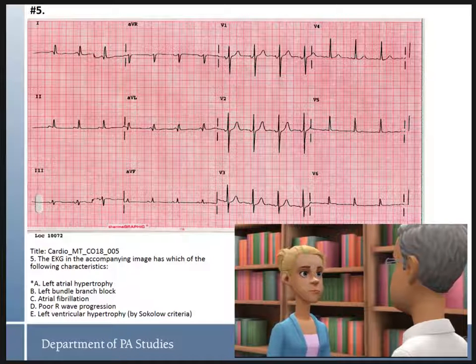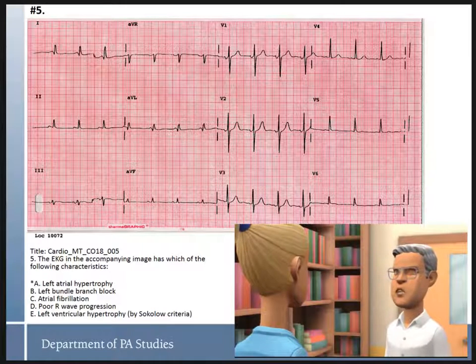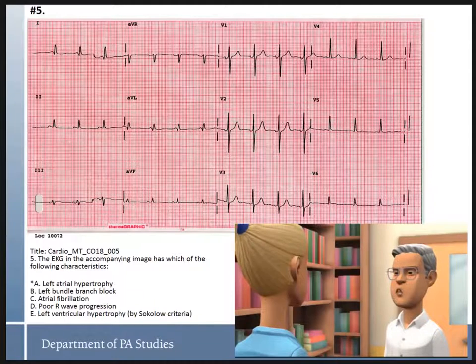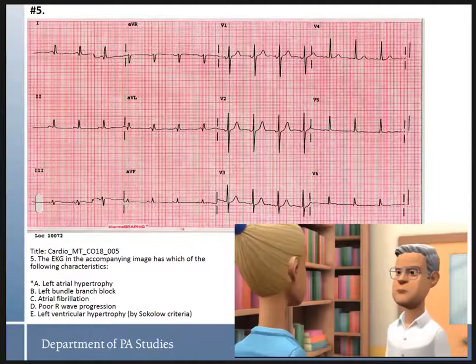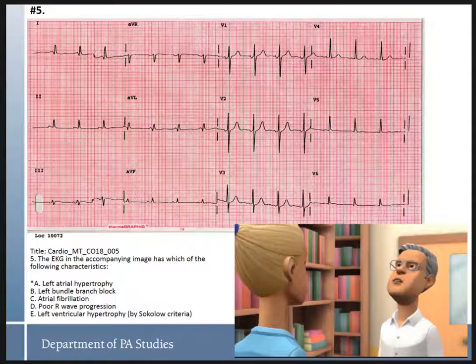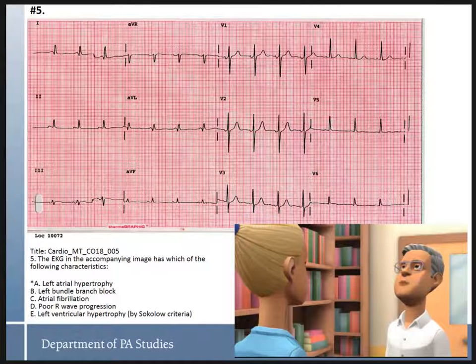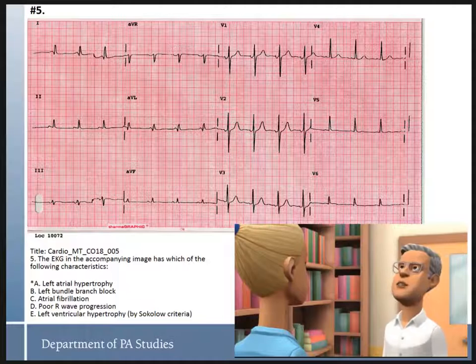I called it a left bundle branch block. If that is truly the case, then I'm pretty sure you should not get credit. To be an LBBB, there would have to be a wide QRS complex. There's absolutely no question in my mind that the QRS is narrow. Oh, is that what I said? I meant that I put atrial fibrillation. Well, then you are still going to miss it, because it is way too regular to be atrial fib, and there are obvious uniform, upright P waves in lead 2.